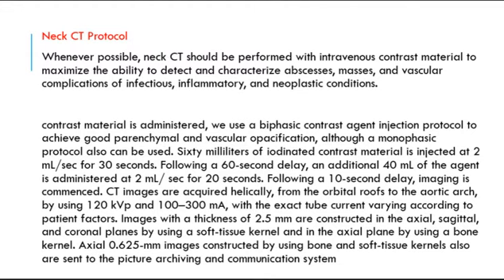Whenever possible, it should be performed with IV contrast. It's very important, unless we have a suspected foreign body. In cases of foreign body, usually we don't use IV contrast because it will obscure the findings of the foreign body. Otherwise, we use a protocol of neck CT with contrast. It's very important, especially in cases of abscesses and in cases of vascular structures. So the contrast material is given.